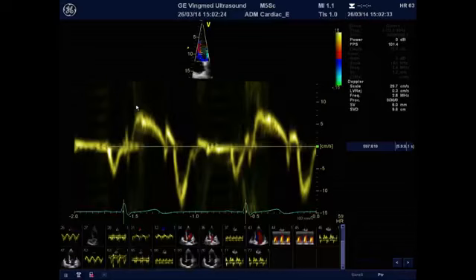Obviously, we will have a systolic wave, which is positive because in systole the annulus moves towards the apex, which is relatively fixed. And then, again, in a patient in sinus rhythm, we will have two waves. The first wave in early diastole, which is called E prime, and is related to the level of myocardial relaxation, and the second wave in late diastole, which is called the A prime wave, and we call them prime in order to differentiate them from the respective mitral flow waves.